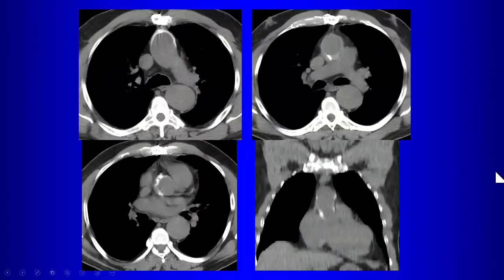Now, whenever you're doing follow-up imaging, it's not unusual for patients who have a history of dissection and have had surgical repair to come back to the emergency room for whatever cause of chest pain they have, and the ER will, because of that history of dissection, order a follow-up study that you will have to interpret.